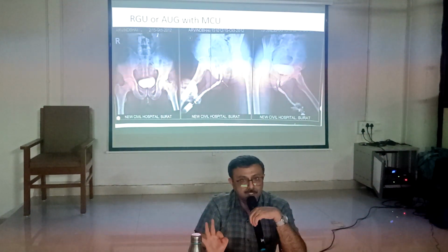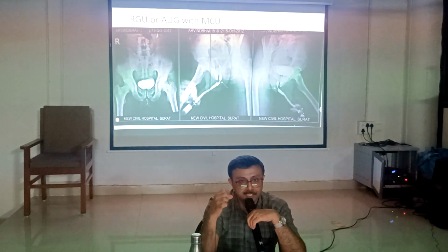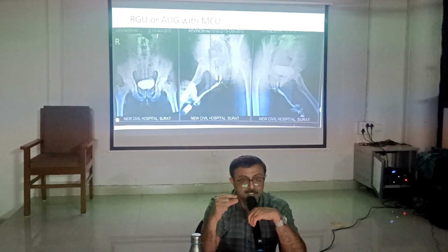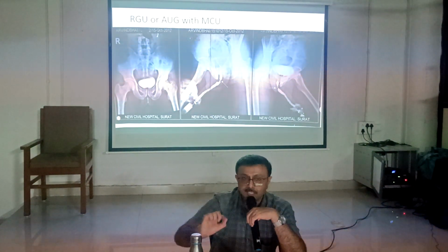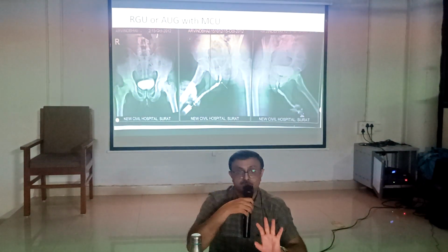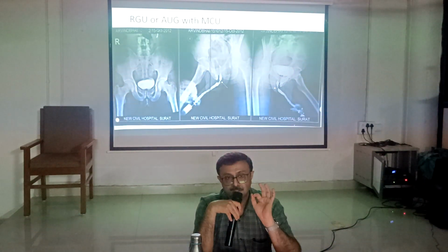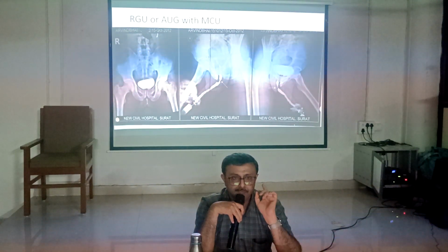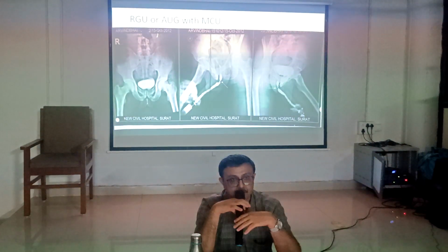Sometimes what happens is complete obstruction. So dye is passing, and dye will not go beyond the obstruction. Complete stricture, sir. So we cannot have any idea regarding the segment of stricture, length of stricture. So we do MCU, which shows the proximal part, the length, and then there is a segment. The length of the stricture area is important. It will define the type of management. Preferable management is endourology, VIU, visual internal urethrotomy. A simple short segment stricture can be dealt with VIU. This is best. Long stricture VIU cannot do. We have to do open urethroplasty.